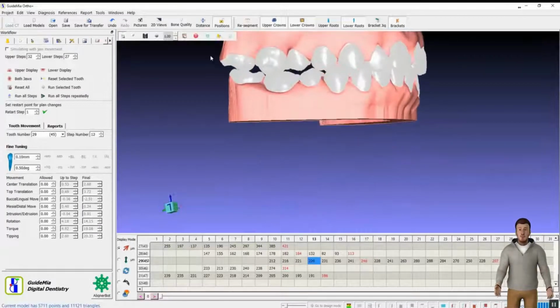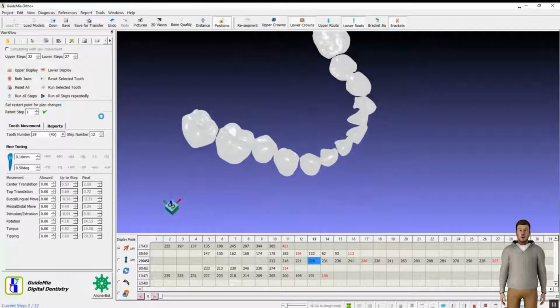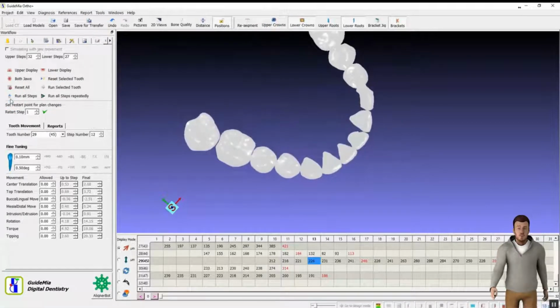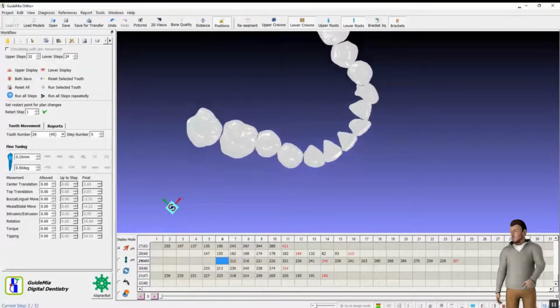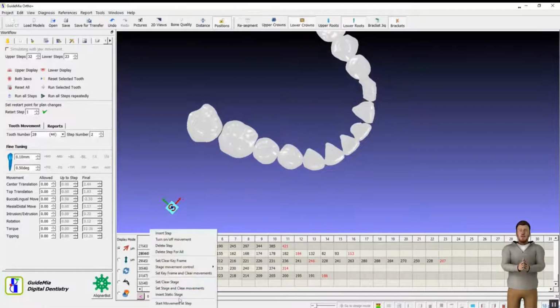At the end of the operation, the system will pop out a message with such information. For each step, the files are exported. In the user pre-selected folder, the file naming convention will indicate the draw, the step order, etc. The output files are standard STL files. We can use any software to view them. In this case, we use MeshLab to view individual steps.